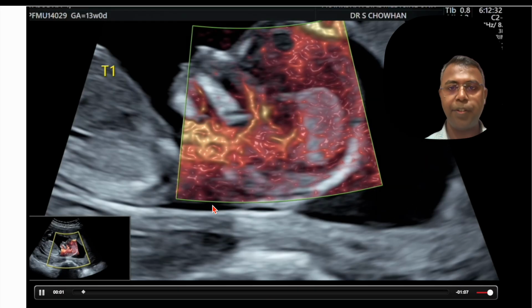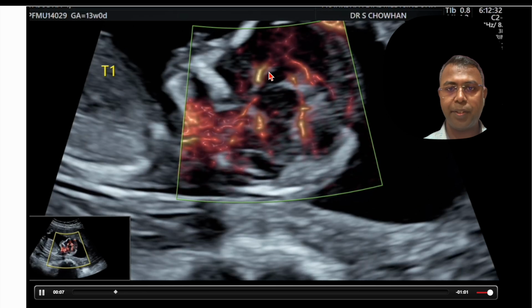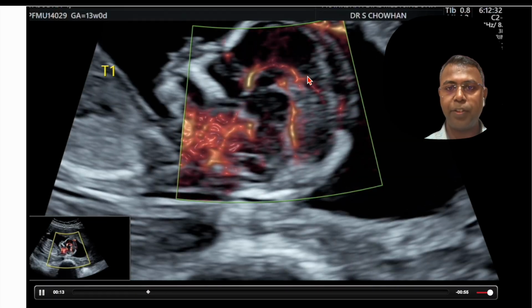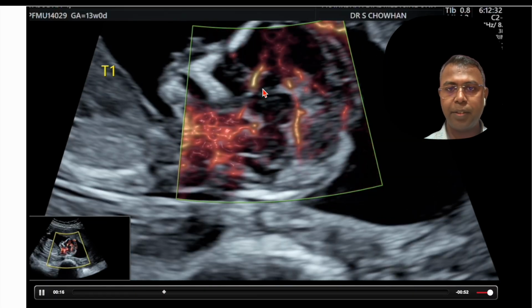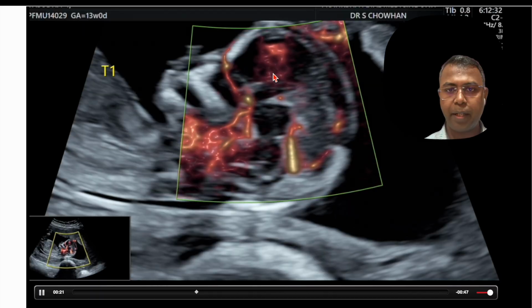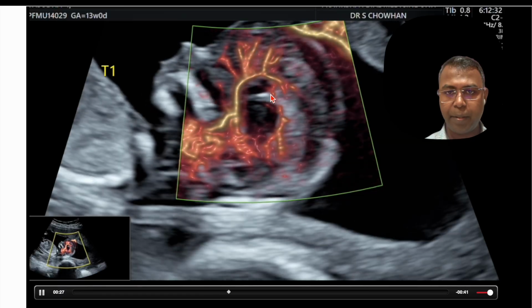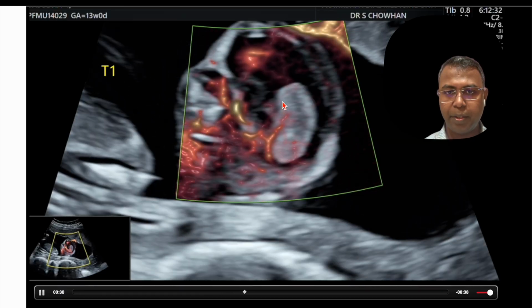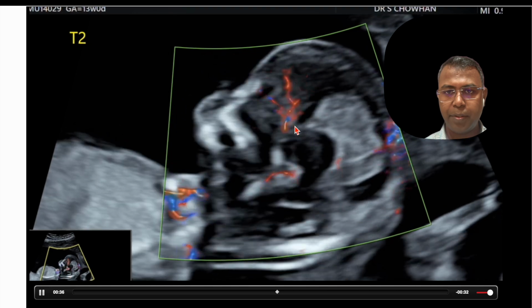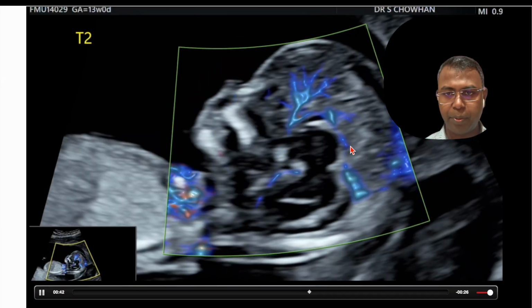So you see this video. Usually when we see this kind of branches, we assume that this is the Peri Callosal artery, but this is not the Peri Callosal artery. This is the anterior cerebral artery, and this part is the callosal marginal artery. This is the callosal marginal artery, and this thin one which is coming here is the Peri Callosal artery. In this picture you will see better that this is the callosal marginal artery and this is the Peri Callosal artery along its course.